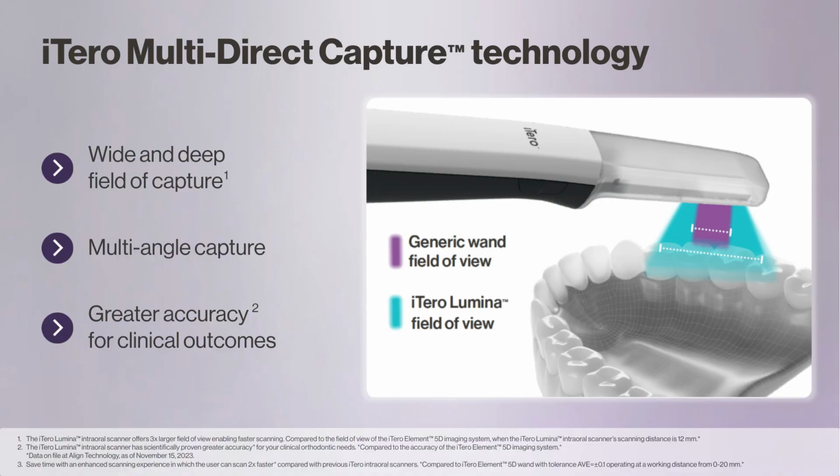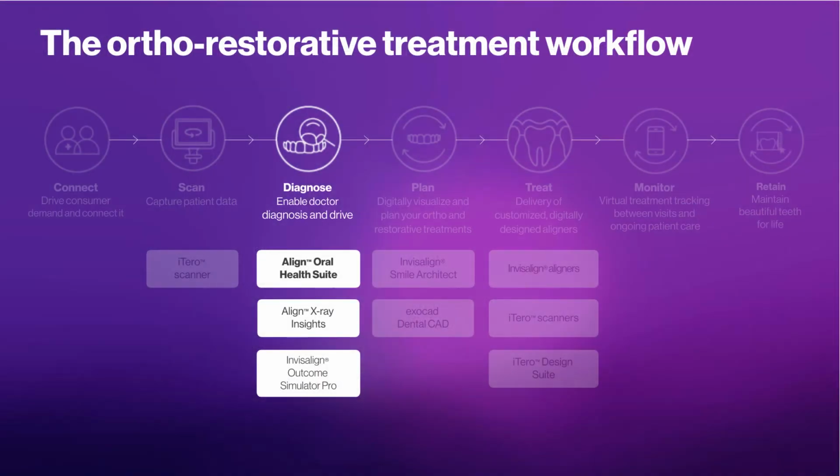It was developed to quickly and accurately capture more data, with photorealistic visualization quality and with less effort for the user. Moving to the next step, the diagnose.